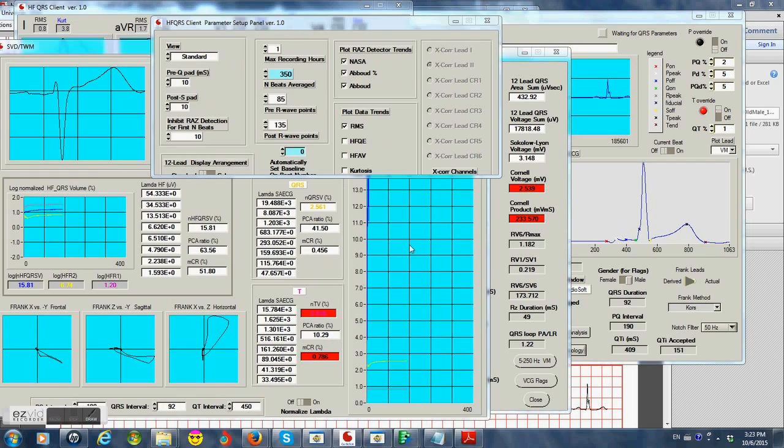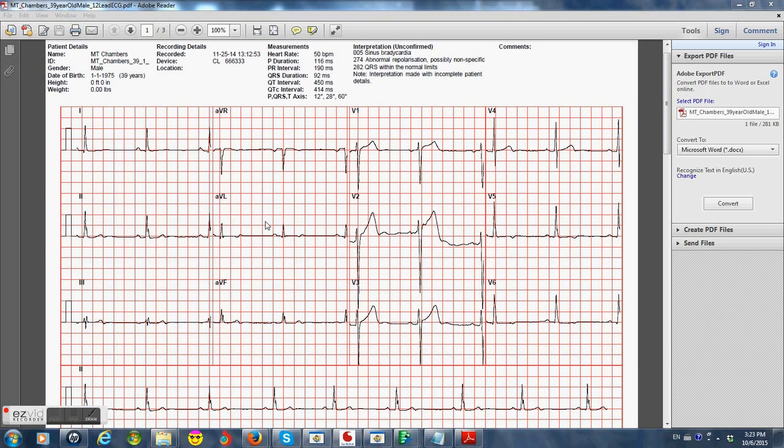Let's go ahead and look at the other application we can look at, which is the T wave and QRS wave complexity or morphology. And we can see that we are flagging in terms of the T wave complexity. We have an abnormal couple of ratios there, not the PCA ratio, which is normal, but we can see a couple of the other ratios that we calculate are abnormal. And therefore, we also have overall abnormal T wave complexity. So if we look at the T wave complexity and the abnormal three-dimensional ECG, we have an abnormal recording.